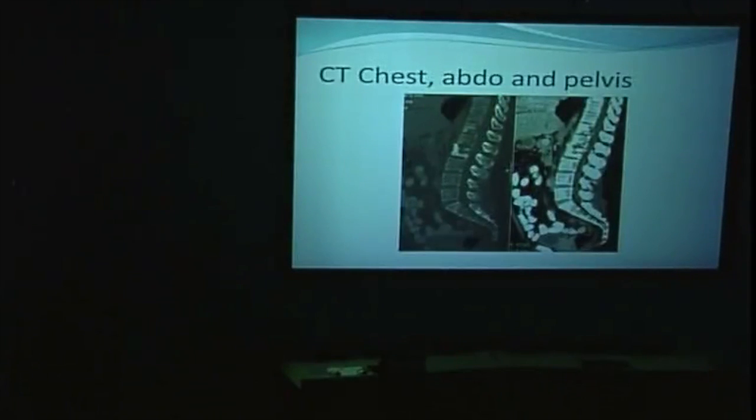Another case here shows the appearance of discitis on CT. Once we do the CT scan, we can reformat it in any plane, because the slices these days are so thin. We can do multiplanar reformats with the same resolution in any plane.